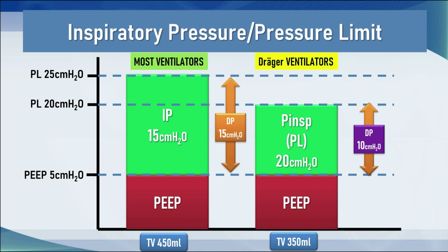You need to increase the driving pressure independently. And while this is a good approach for preventing the unthinking crossing of that 30 centimeters of water Rubicon, it is something extra to think about when you're setting the ventilator, and mistakes may happen if there are multiple ventilator brands in the ICU. So be aware of that. When you're setting the Pinsp, it is not the driving pressure. It is the plateau pressure that you're targeting there.